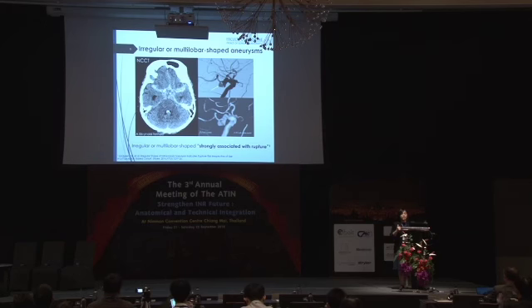This slide shows imaging studies of an 86-year-old woman presented with diffuse subarachnoid hemorrhage. You can see that there is an irregular aneurysm at the origin of the right PCOM right here. An irregular daughter sac is protruding from the dome of this aneurysm.